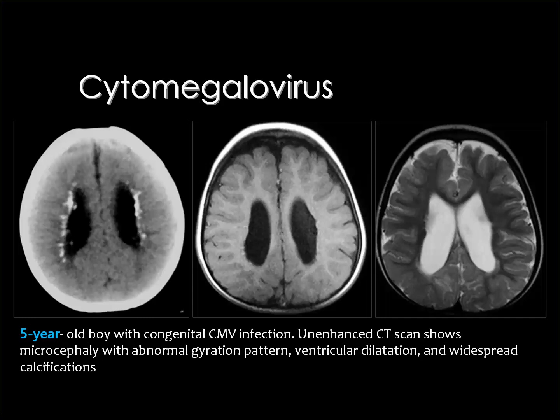Then you remember that the small calcifications seen on the CT are not seen on MRI. And this is an example. This is a patient with cytomegalovirus, see periventricular calcification that are not seen in the T1 nor in the T2 weighted image. So if you started your exam by MRI, you will miss the diagnosis.